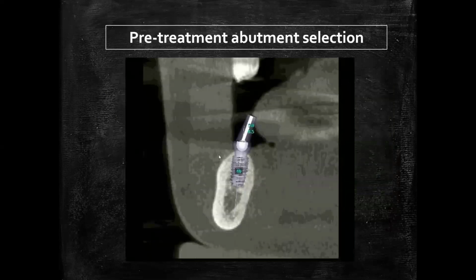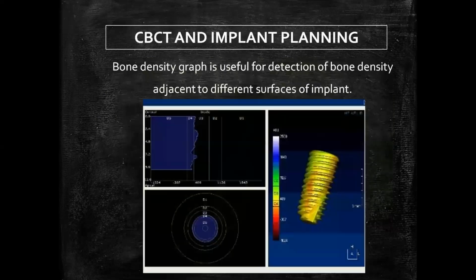You can always place an abutment over your implants, so you need to be more prepared. The software prepares you for the outcome of your treatment, so in case you have to place a customized abutment or an angulated abutment, you will have determined it well before the surgery with the help of software.